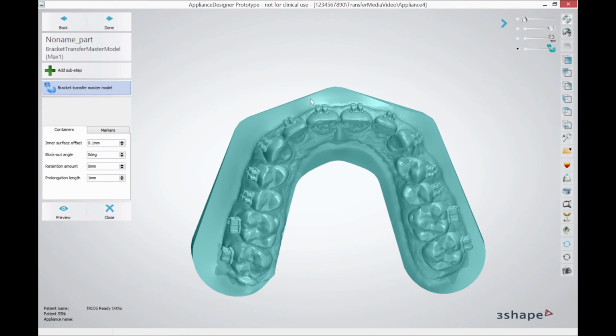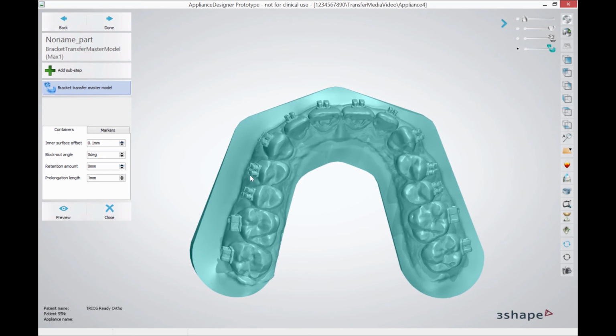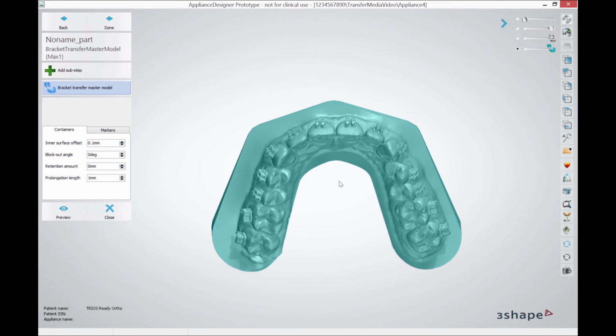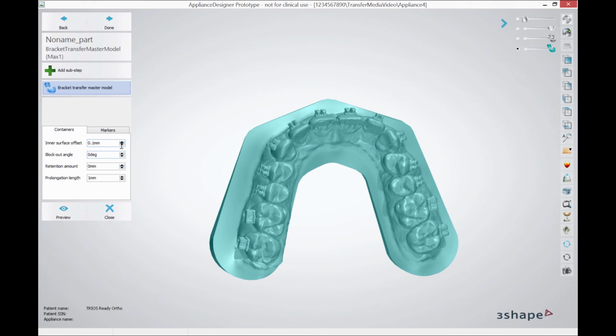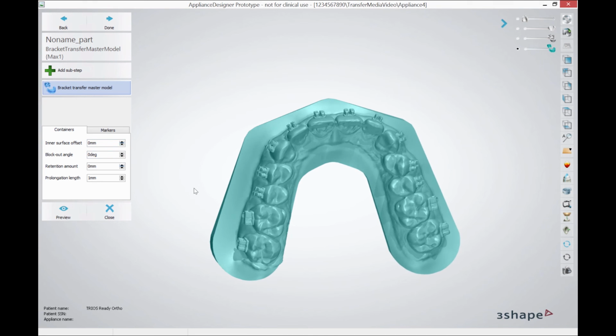So when you do your suck down on top of these, then the hole for the bracket will also correspondingly be bigger. So there's no value we can just give you now that would be the right one. That will have to be a little bit experimental depending on exactly how your printer is fine-tuned and also the material properties of the material that you have loaded into the printer. But start with the standard setting and work your way up from there.